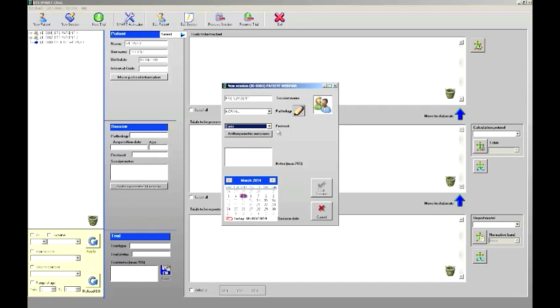As we explained in the previous session, if you need to change the position of the marker from the 5th to the 2nd metatarsus because the patient has a supine foot, you have to select the corresponding protocol Davis 2nd metatarsus. We select the standard Davis protocol.